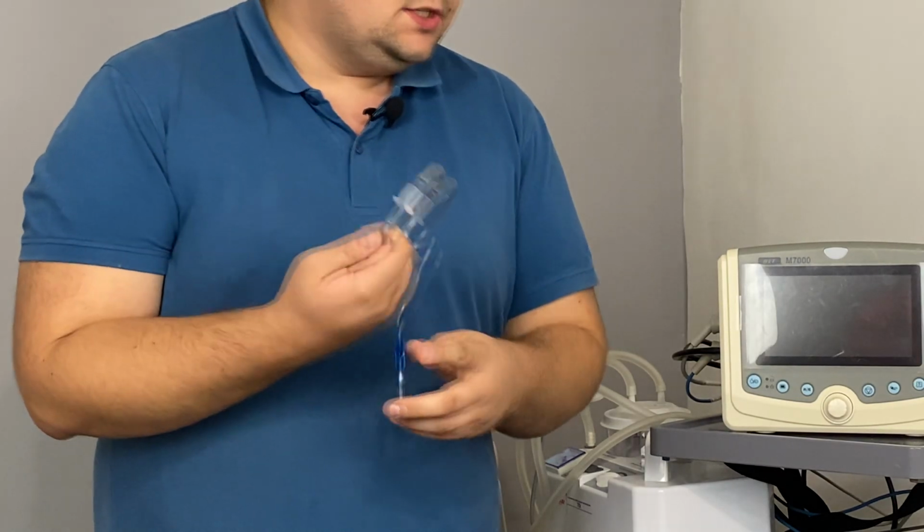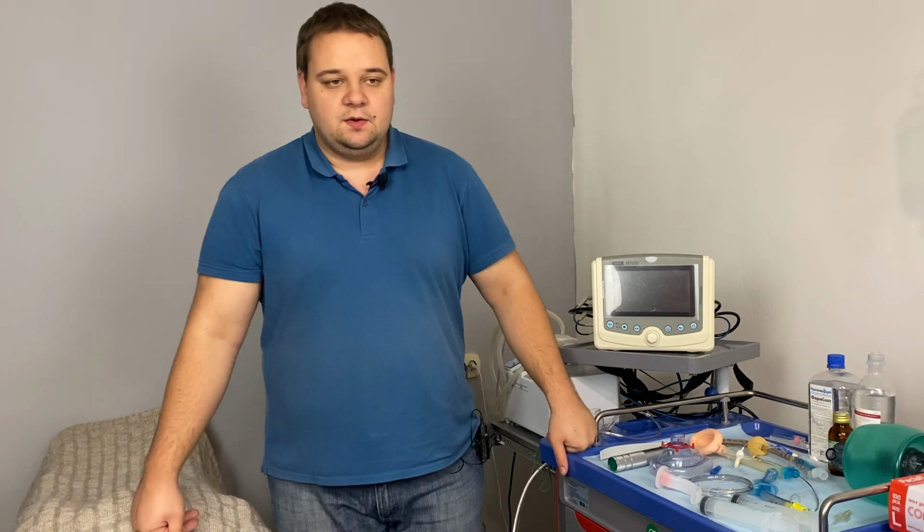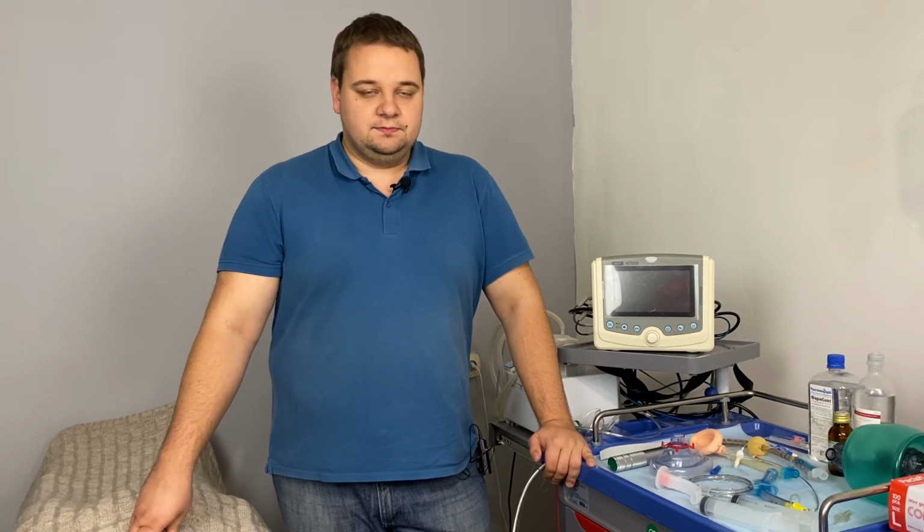So they invented this tube. There was a time when there were special medical professionals, a subtype of nurse, which was called the intubator. It was a nurse who was responsible only for tracheal intubation, and before the operation day or in the emergency department, they were just called when we needed the procedure, when we needed the intubation.